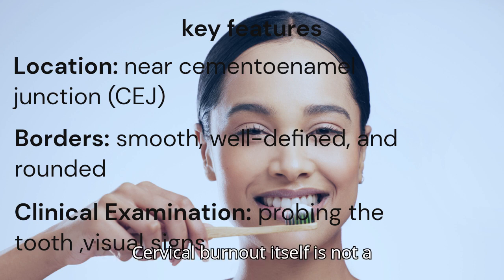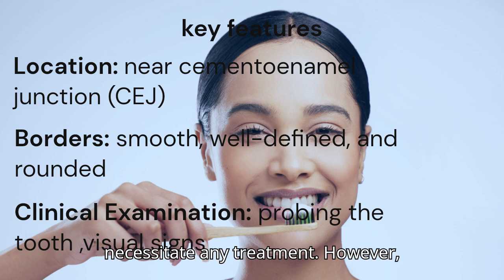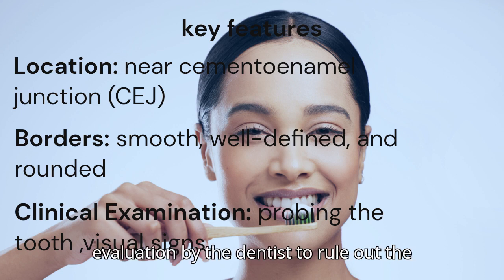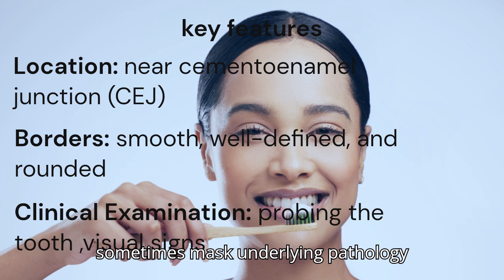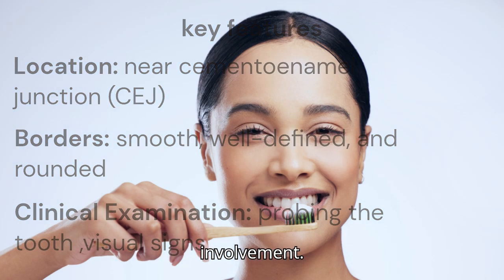Cervical burnout itself is not a pathological finding and does not necessitate any treatment. However, its presence on X-rays warrants further evaluation by the dentist to rule out the possibility of actual dental caries. Additionally, cervical burnout can sometimes mask underlying pathology, such as root resorption or furcation involvement.